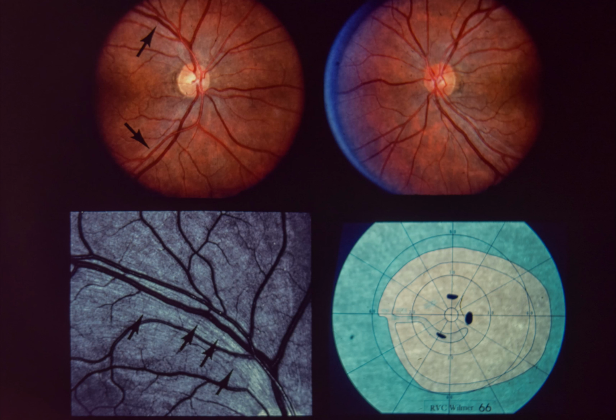Upper left. The right optic disc shows temporal pallor. Dark slits are present in the superior and inferior arcuate nerve fiber bundles. Upper right. The left optic disc is normal, as is the peripapillary retinal nerve fiber layer. Lower left. Arrows point to slit-like defects in the superior arcuate temporal bundle in a red-free photograph of the right eye. Lower right. The visual field in the right eye demonstrates an inferior arcuate scotoma extending nasally along the horizontal meridian and corresponding to the dark grooves that represent focal axon destruction.